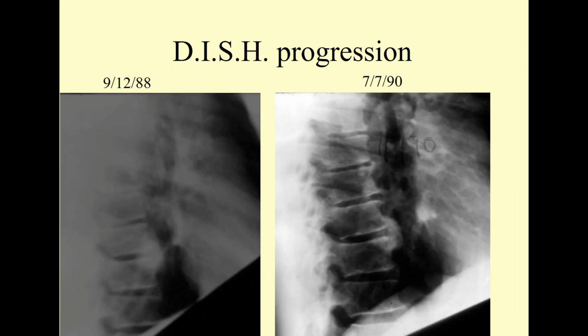Now, my point here, when you take a look at the study guide I put together, which includes perivertebral ossification patterns out of Chapman and Kelly's very useful handbook, Aids to Radiological Interpretation. They've got patterns where they identify the claw-shaped osteophyte. They sketch for us what the traction osteophyte looks like. We've seen examples of that in prior presentations. This is the standalone undulating pattern, or I say flowing exuberant ossification, and the only thing that produces this is, of course, DISH.